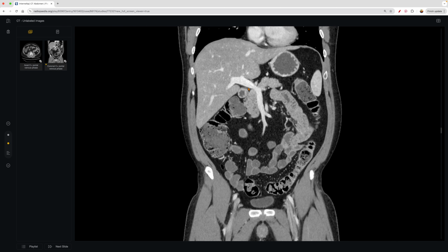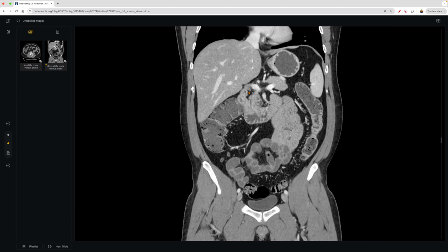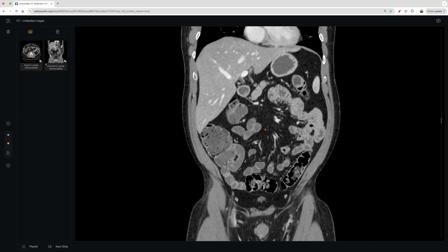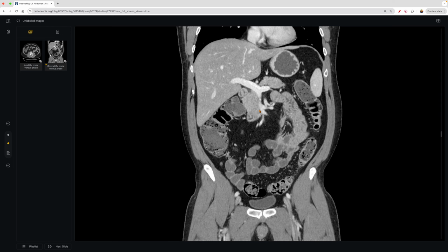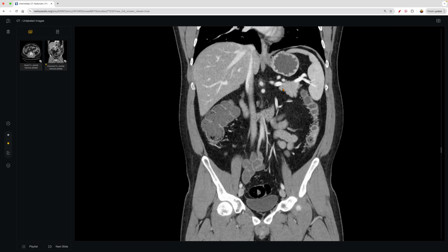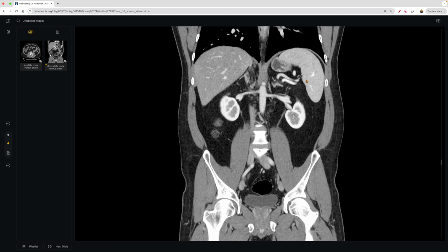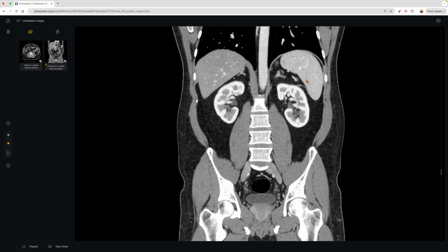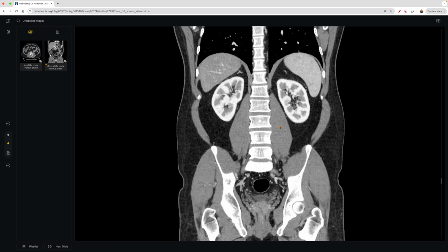So otherwise, you can see here the vasculature, so the portal vein, and then we'll have the SMV coming off of that as well. And then, so the superior mesenteric vein, and then we have the inferior mesenteric vein, and then the splenic vein going through the spleen. Again, if you can identify that, that's fine, but for medical students, again, just appreciating the image is most important.